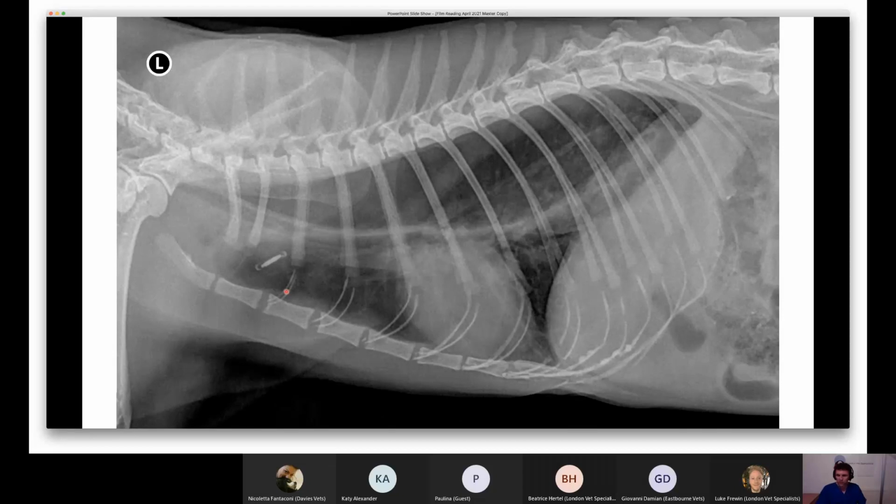And then there are a whole bunch of other reasons why a patient might have megaesophagus, ranging from acquired conditions, things like neuropathies, myopathies, toxicities, metabolic problems. There are other neurological problems like dysautonomia in dogs, Key-Gaskell syndrome in cats. You can have hiatal hernias that sometimes will result in a megaesophagus, and various other things. So the differential list for megaesophagus is quite long. That was the main reason to include this case, to allow us to review all of the possible causes of megaesophagus.